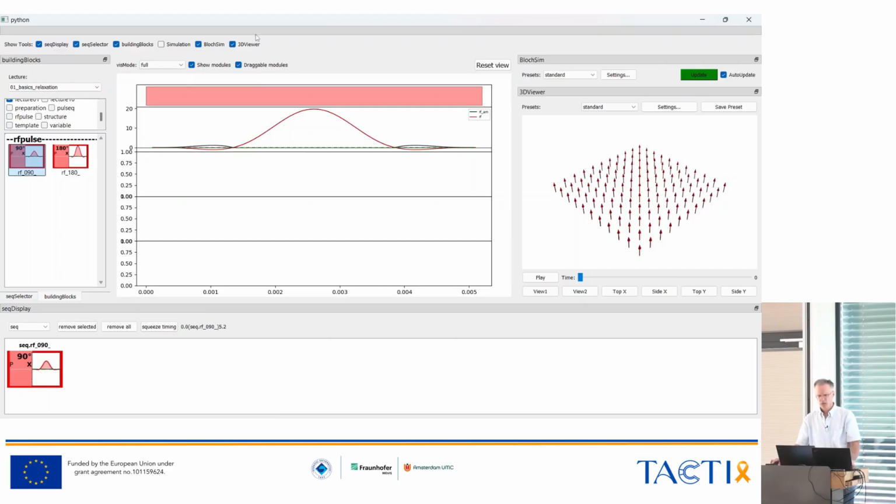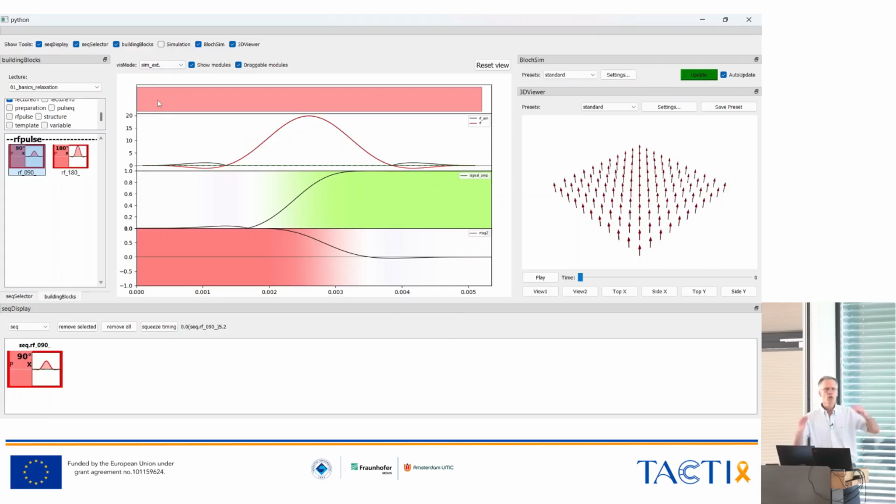So right now we would have the gradients. I said gradients we don't need. So we would switch to another visualization mode by just going to this visualization. And I would recommend for you to use this simulate extended. And all the other lectures will pre-configure this extended simulation mode, because that one moves everything which belongs to the sequence into this part here.